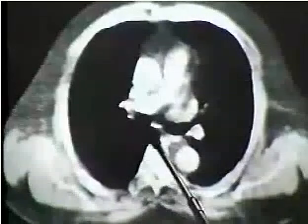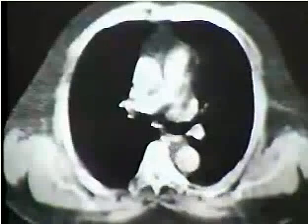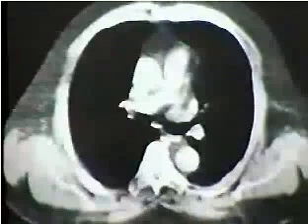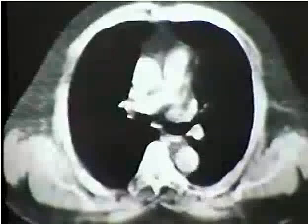A little density here between the bronchi, as we will see. That is a frequent variant, a little perhaps of a calcified node, or perhaps just a little bit of cartilage at the bottom of the carina, giving a small dense shadow, otherwise surrounded by fat.